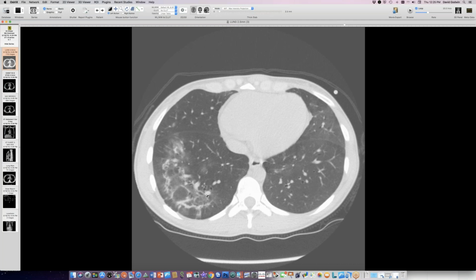Now the pulmonologist, because of the time course of it, thought it might be related to some infection that she'd had, something else that set off an organizing pneumonia. But I think radiographically it fits very nicely for organizing pneumonia initially, and then in terms of evolution, I think it's even stronger. Yeah, that's a nice example. Okay. All right.